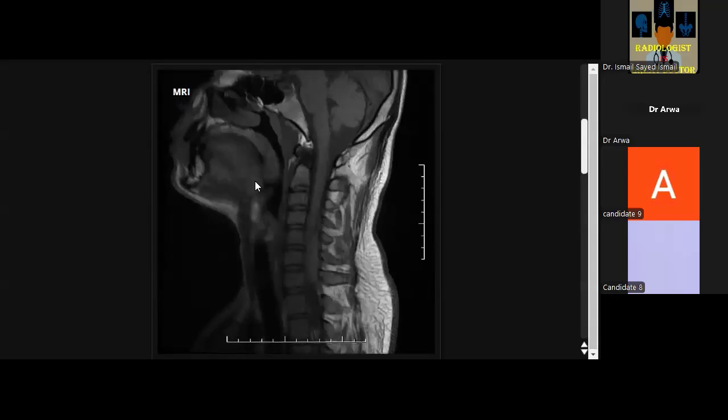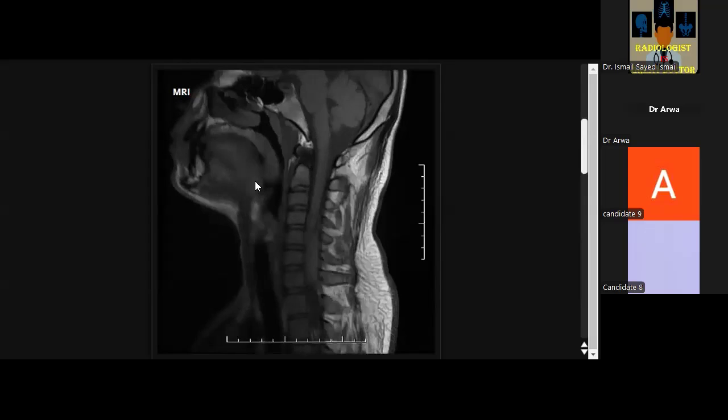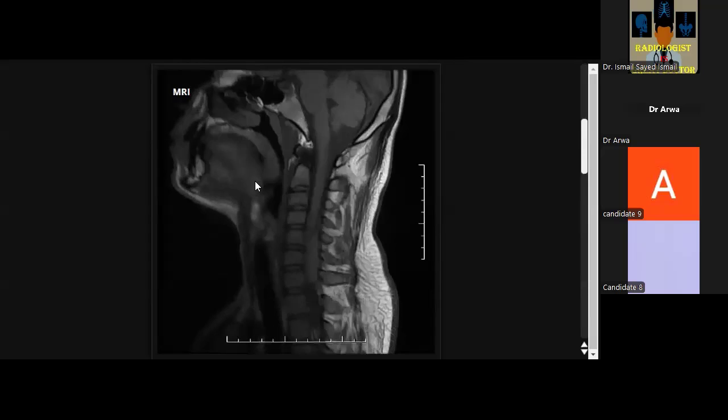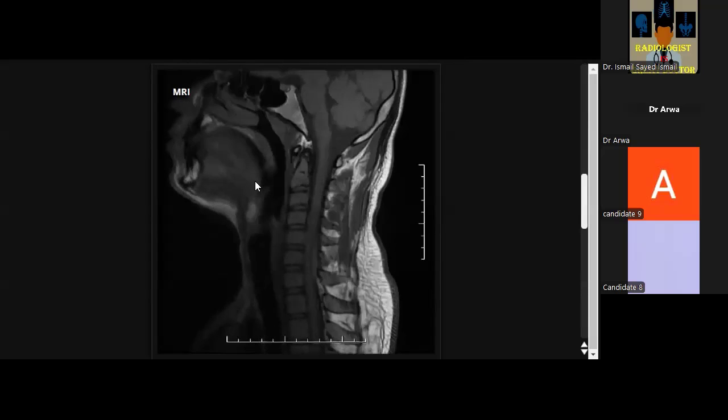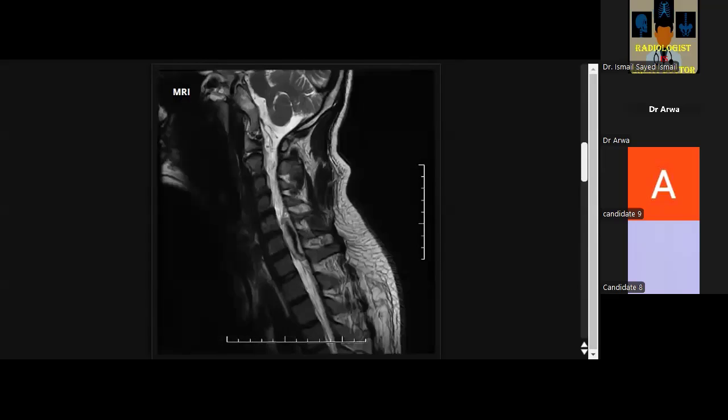Okay, I've been presented with T1 weighted sagittal cervical spine images. I can see that there is a well-defined broad-based area in the posterior thecal space, which is making a broader contact with the posterior neural arch, and it appears to lift the dura anteriorly, the hypointense line of the dura on the superior aspect. The lesion is extending into the spinal canal, causing compression of the spinal canal. I would like to confirm the findings on the axial T2 weighted sequences if I can.